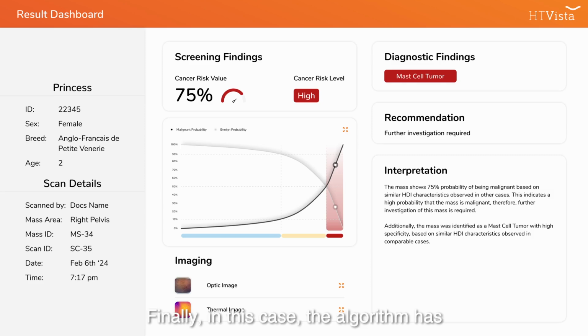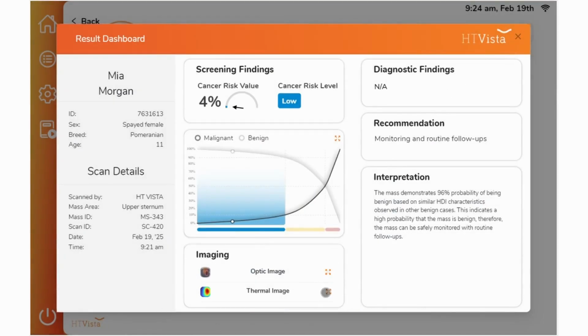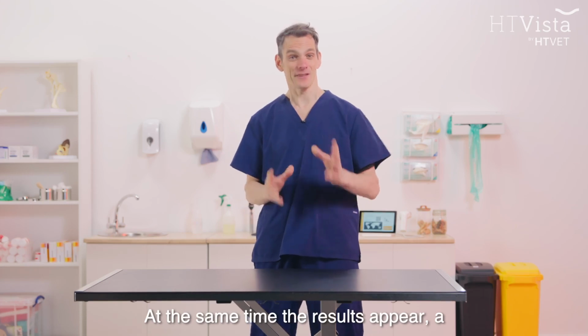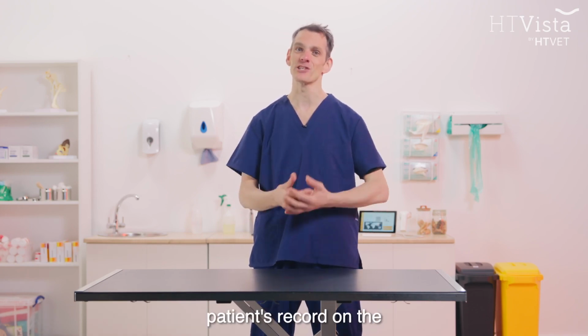Finally, in this case, the algorithm has also identified this mass as a mast cell tumour, and a diagnostic alert appears in the top right corner of the screen. You can use this information to guide your diagnostic plan for that individual patient. When you're discussing the results with pet owners, it's handy to enlarge the images you see on the dashboard. At the same time the results appear, a PDF report will be sent to an email of your choice, which can be shared with the pet owner and attached to the patient's record on the patient management system.